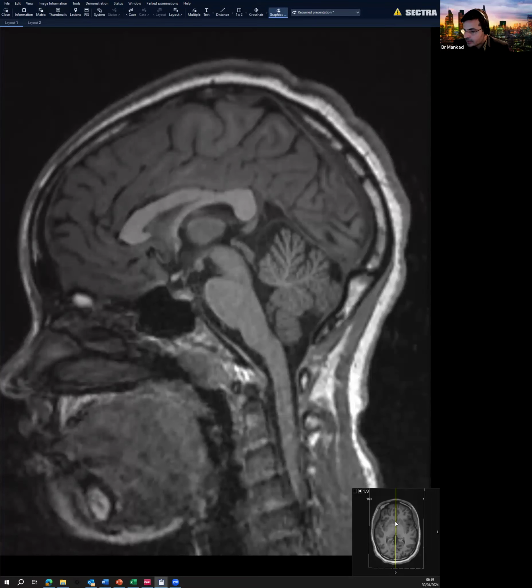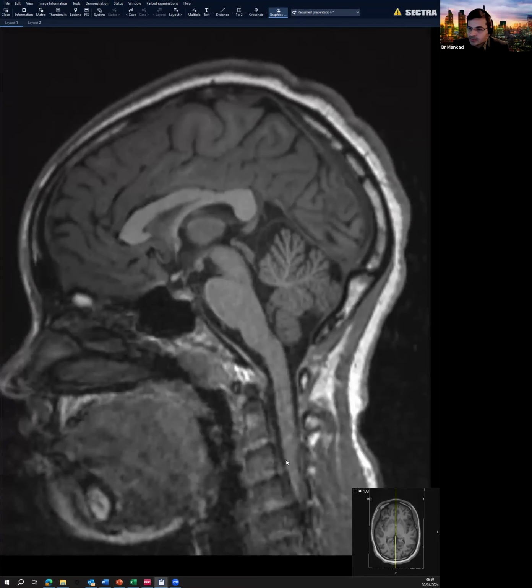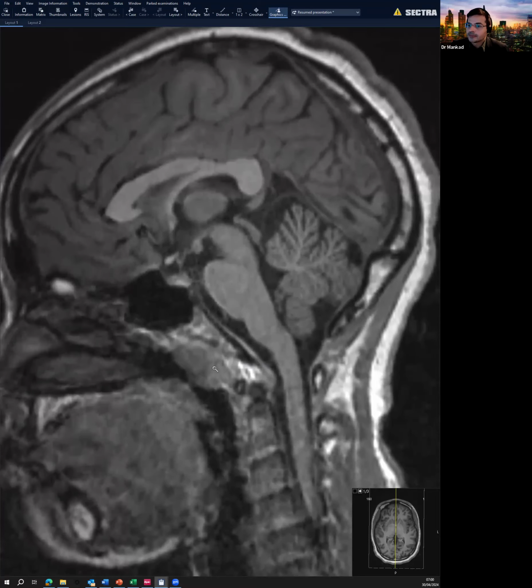If you see my picture here, the thumbnail, the technology is so good that it tells you exactly where you're looking at, and it will tell you where you're left or right. Just your PAC systems will do that for you. But the midline sagittal of the brain is an important landmark because there are many, many monuments to look at here. So once again, I'm going to ask you what is the name of this structure.